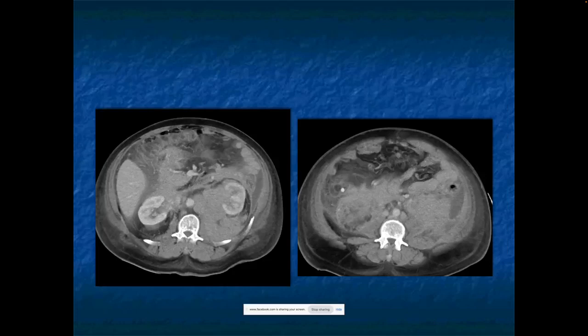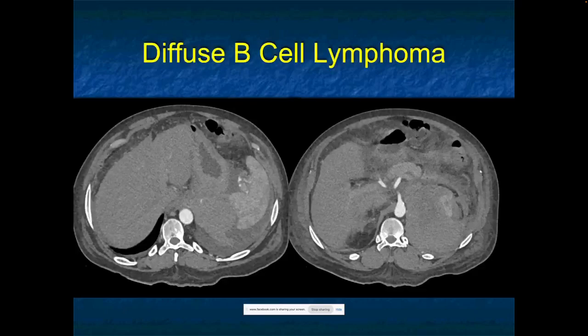This is a good example of lymphoma. Lymphoma has many appearances, maybe 5 or 6, in the kidney, from single solitary mass to multiple masses to diffuse infiltration, unilateral or bilateral, and then also involvement of the peri and pararenal space. Sometimes melanoma can simulate this, but usually when you have such bulky peri and pararenal space, you're talking about B-cell lymphoma.